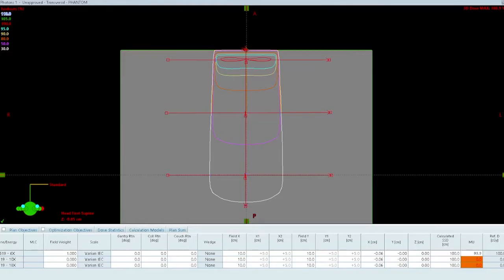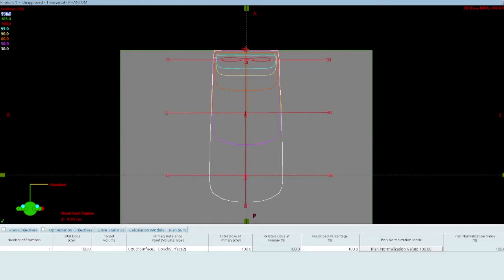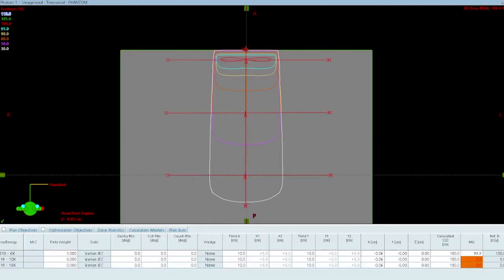The isodose lines are in relative percent. In the upper left-hand corner, you see isodoses and then the little parenthesis in percent. So 100 is 100%, meaning it's my prescription. My dose prescription is 100 centigray times 1 fraction. So, working out the math, 100 equals 100 centigray, and then so forth down. What the isodose lines represent are basically dots within this three-dimensional volume that have been connected by similar dose levels.